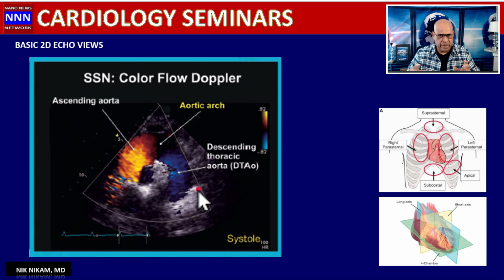And then we take all these 30 or 40 or 70 images we do and come up with a composite report. Echocardiogram is a pretty time-consuming, tedious process. It takes 45 minutes, an hour to do a study, especially if you're dealing with valvular heart disease or some congenital abnormalities. You may spend hours getting good quality images. Then you have to process those images, compile them together, and come up with a composite report.